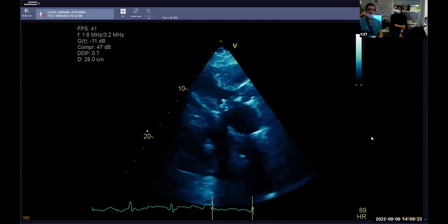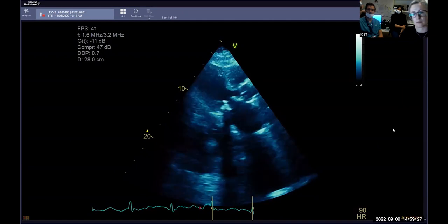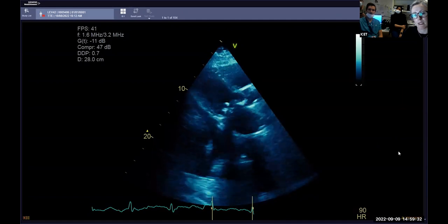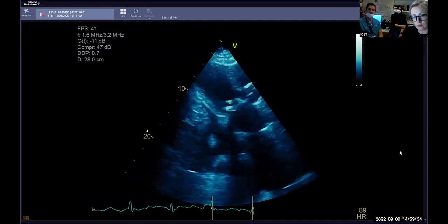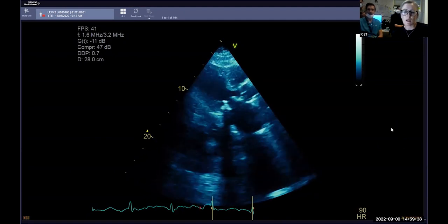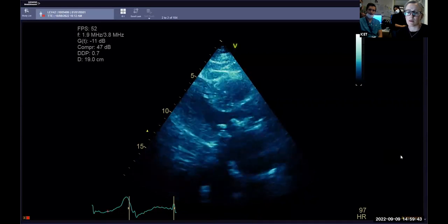In terms of other structures, we can clearly see the bioprosthetic mitral valve. There's some dropout deep to that. It looks slightly irregular, doesn't quite look exactly like you'd potentially expect a bioprosthetic valve to look. However, you can clearly get artifacts in transthoracic echo. I might just skip through a little bit, Chris, just for time. What do you think of the LA dilatation?